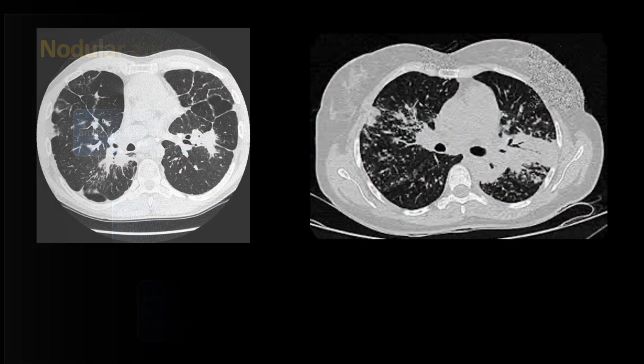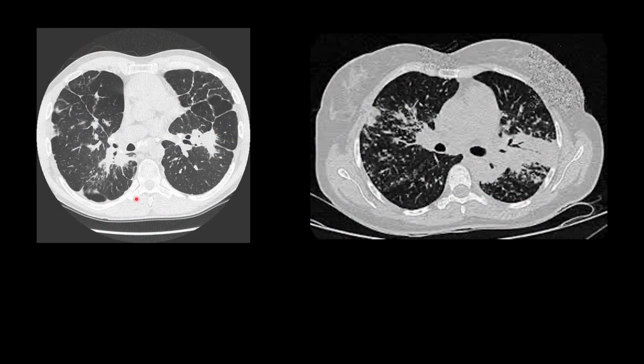Let's look at how that looks. So here you can see there are tiny nodules, but again they are subpleural, rather a grouping of these nodules into this irregular consolidation or mass-like structure. But you can see there's a lot of structural distortion here, and again in this region you see a lot of nodules and in the peribronchovascular region a consolidation, and this time this consolidation also has an air bronchogram.